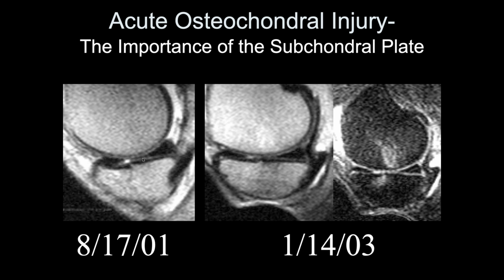So this is the acute injury here, where we can see an impacted fracture of the subchondral bone there. This is fluid collecting in here in the joint space, and we don't really see the cartilage very well right in through this particular area. This is a low field scanner, so we don't have adequate resolution to see it on this study. I thought the cartilage was maybe a little higher than that. I'm just guessing, John. You guys know more about this than I do.